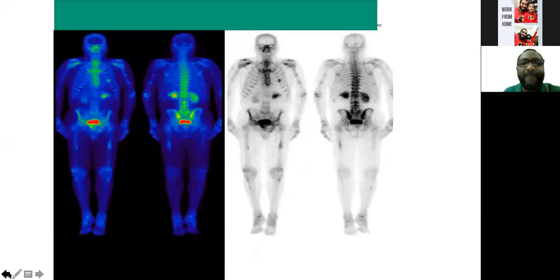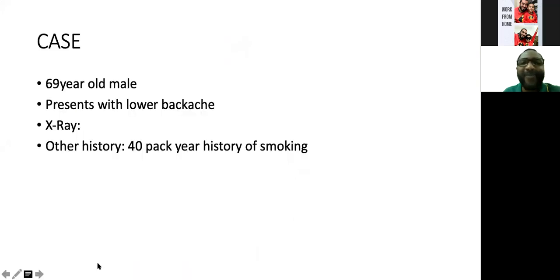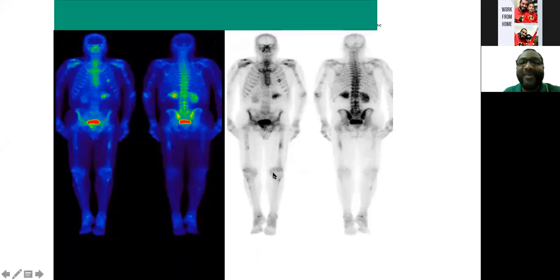Great. Can I ask one more question, Doctor? Yes, please. In the first case, one of the vertebrae had no uptake. You want me to go back to another patient or this one? The first patient. Number one, yes. Okay. Let's see here, there is a vertebra, I think L3 or L2, that has reduced uptake. This one? No, higher up, between both kidneys. Yes, this one.